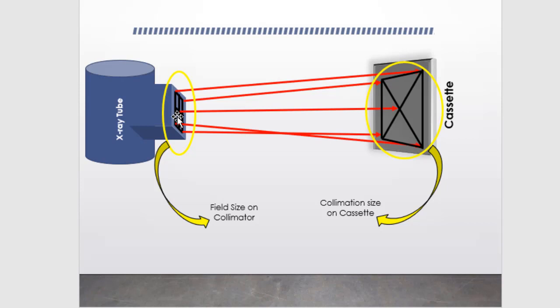For example, for chest X-ray, you intersect the line between the inferior angle of the scapula and the MSP, mid sagittal plane. So you will get an estimated placement of T7 for PA erect chest. But in the radiograph, you need to use the X, connecting all the borders. You can see here the actual collimation. If 4-side collimation is present on the cassette, you can use that border or connect the borders using the X in order to identify the central part. It will be similar. Make sure that it is exactly the center.